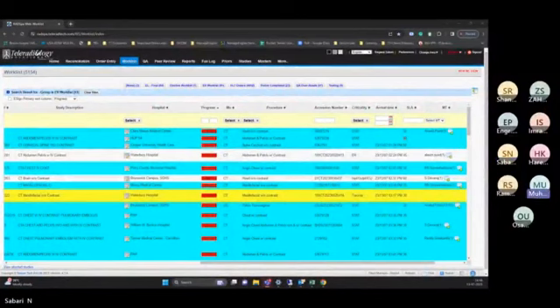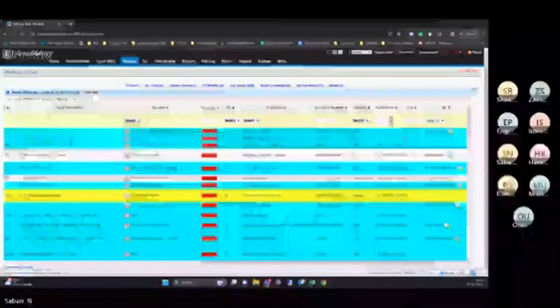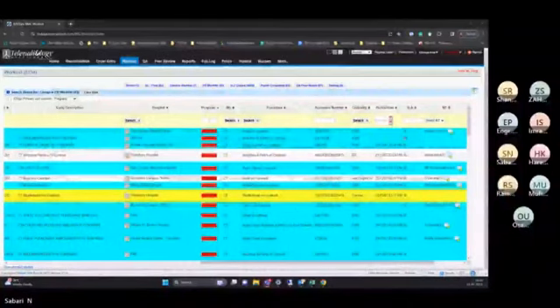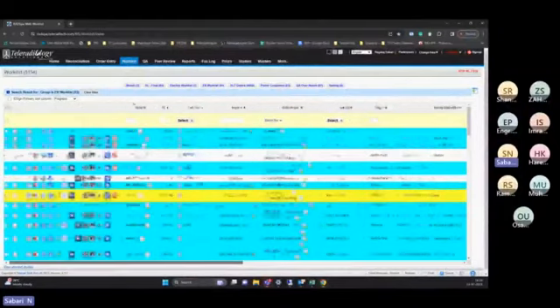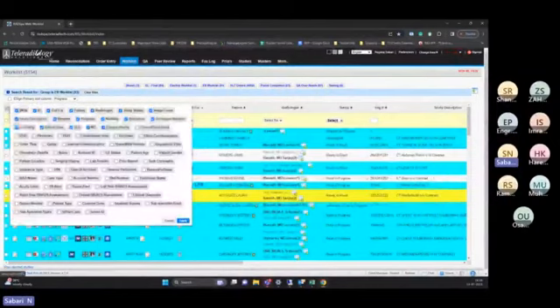Okay, go ahead. Okay. So this is all related to the patient demographic details, everything related to the scan. And if you still want to add or reduce some more functions, here we have an option called.